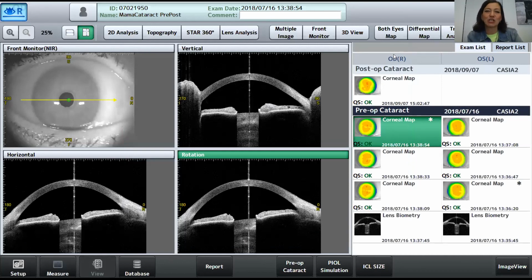I like this function a lot because you're getting used to the CASIA, you're getting used to all the default scans, and I think our preset scans are a lot. But I like this function because you can really go very detailed to your needs. And this is something which makes it very special.